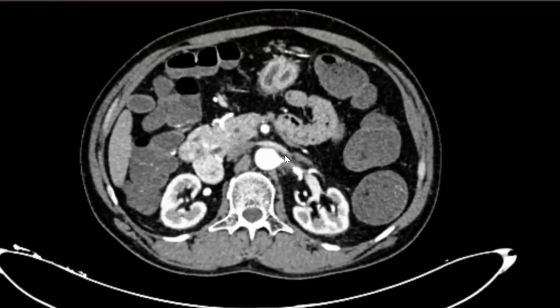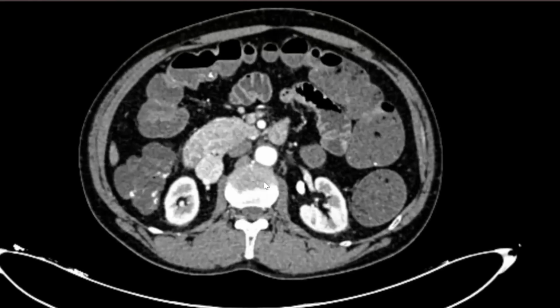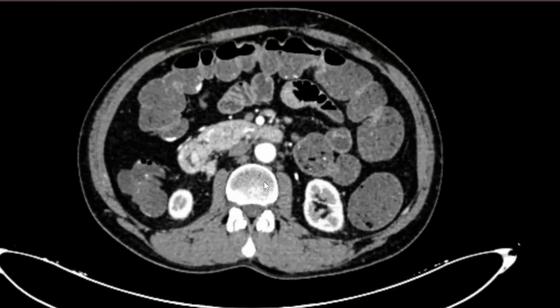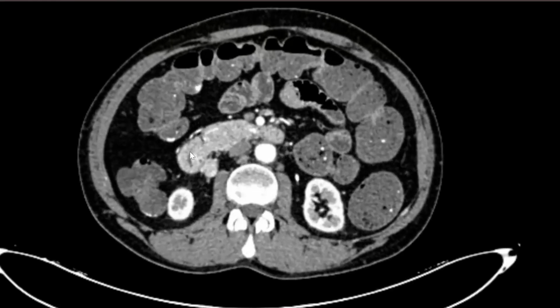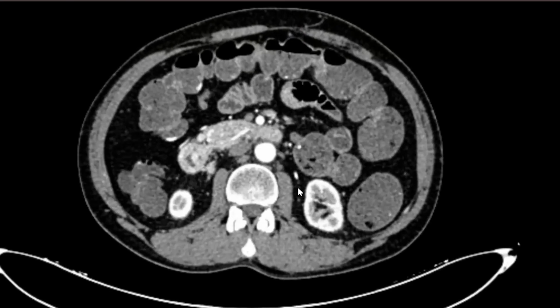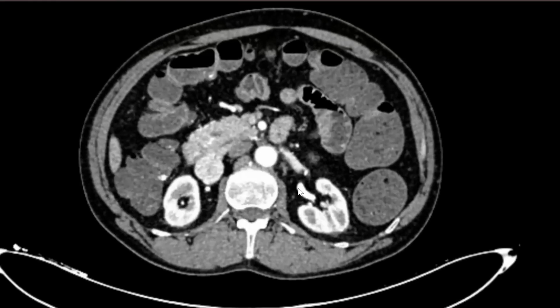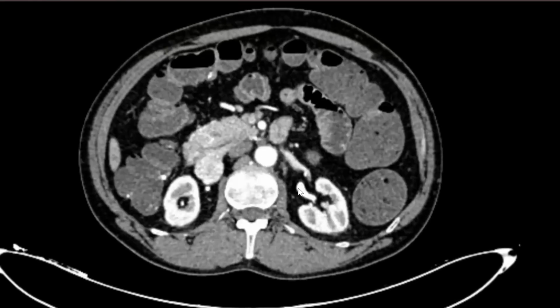Yes. Now, when I tell you neuroendocrine tumors over here, another over here, then you look at the duodenal wall. You pointed out there is thickening, but do you appreciate another enhancing lesion here in the wall of the duodenum? Yes, sir. Passaro's triangle. So these are multiple gastrinomas with a typical location in the Passaro's triangle. Can you tell me the boundaries of Passaro's triangle? The head of the pancreas, then the cystic duct CBD junction, and the second and third part of duodenum junction.